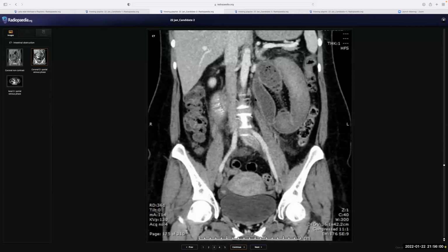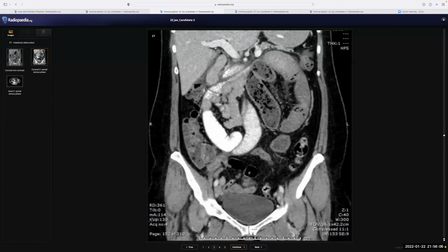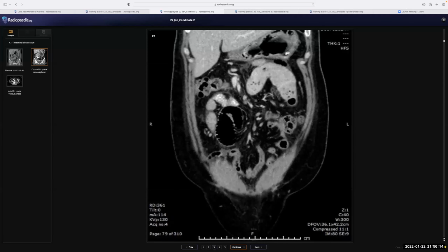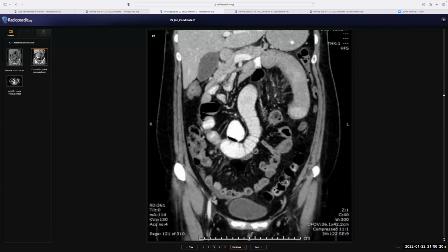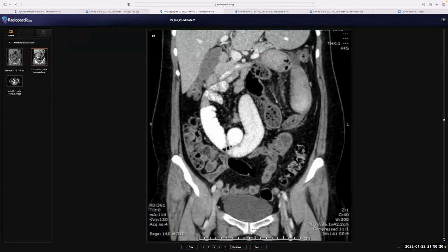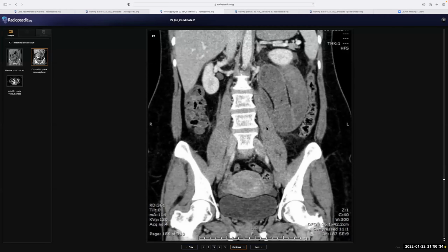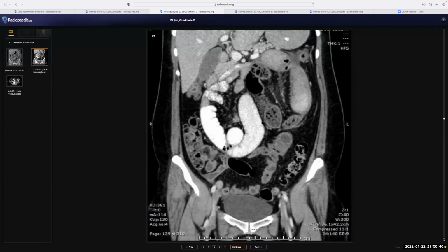So this could be a case of internal hernia as well, which might give rise to this. Commonly it's via the paraduodenal or along the paracolic, but somehow I'm failing to identify the exact point. But anyhow, I will call the surgeon and tell him that this is a surgical abdomen, and the patient should be taken to the OR for the relief of the bowel obstruction in this patient. Okay. So next case.